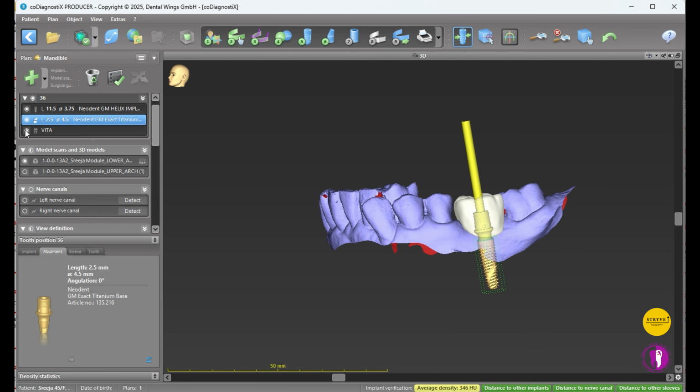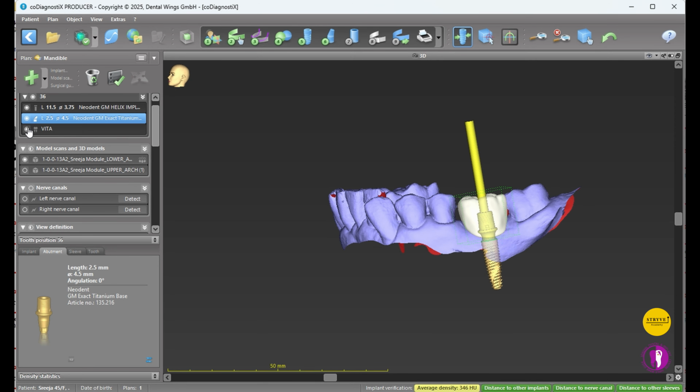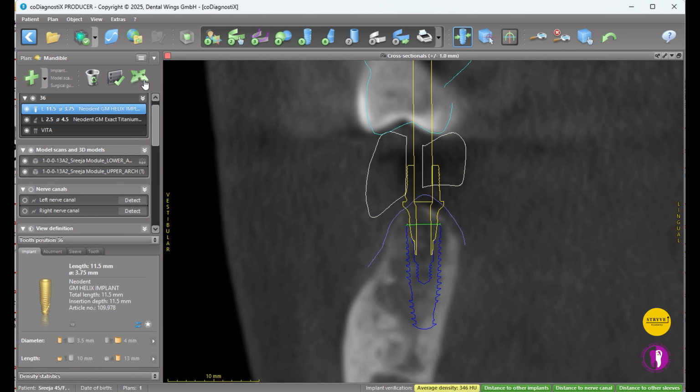Now if you see the tooth, yes, here exactly in the middle of that particular tooth, mesiodistally. Yeah, when you check with the occlusion also, it is the same. So now you are seeing the tooth, and the prosthetic tooth, the implant, and the relationship of the abutment. Okay, it's a very thin bone. That's why we are placing the implant far more inside.